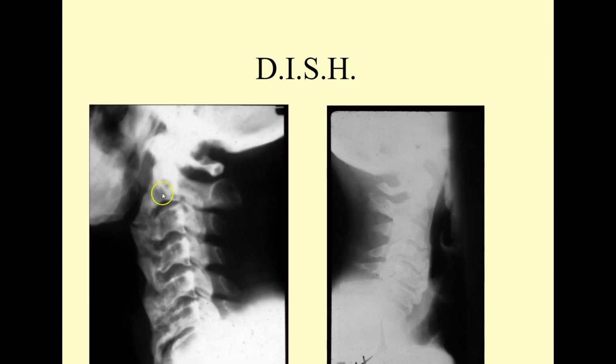Here's two great examples. This is my best example of anterior longitudinal ligament hypertrophy as part of DISH. And make note of, look at how this spacing looks pretty good. Now down here, this is an example where we have DISH on the front side, and independent, still present, is a posterior osteophyte. So this level, we could argue, has both DJD, but predominantly we're looking at the DISH.